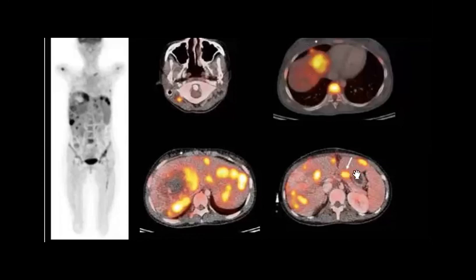So now you have a pediatric patient. I can tell you the age is about 14 years old with bone, lung, and maybe some odd metastasis like in the pancreas. And so what is your differential? You need something very aggressive. I see Nermeen, she's clever, our star.